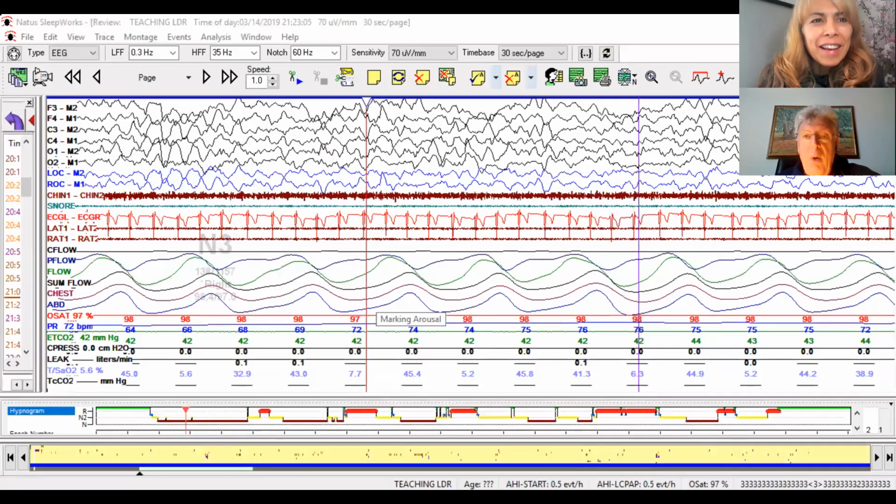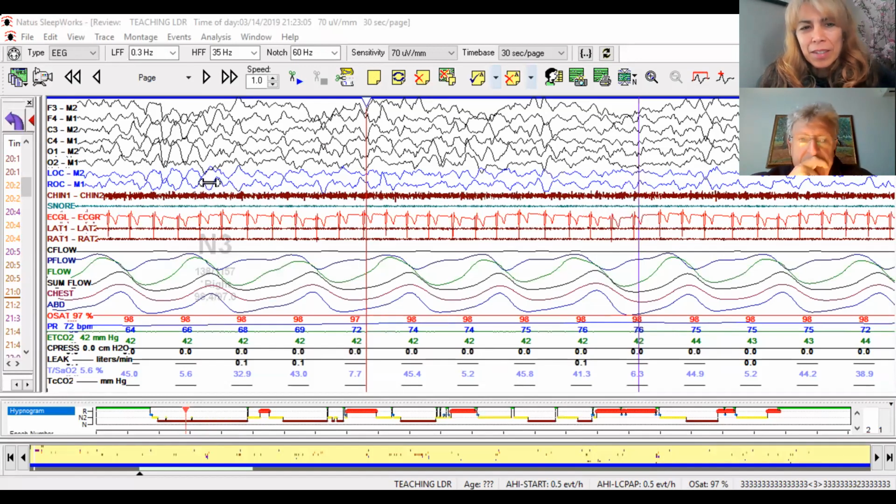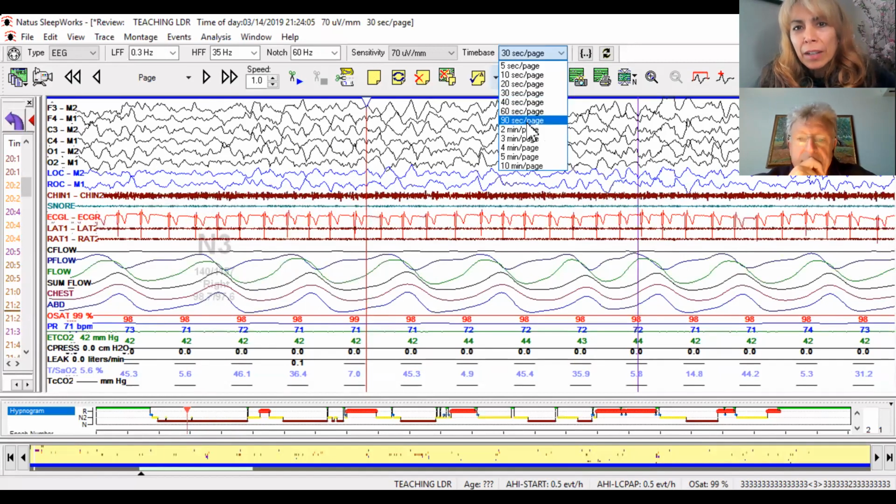Thank you. So now to put in practice the review of the scoring, let's go over a sleep study, and we will both comment on these points. This is a pediatric sleep study using our own system at the children's hospital. And we'll scroll, and right now we are at 30 seconds. Most of our techs score in 60, 90, or 2-minute screens.